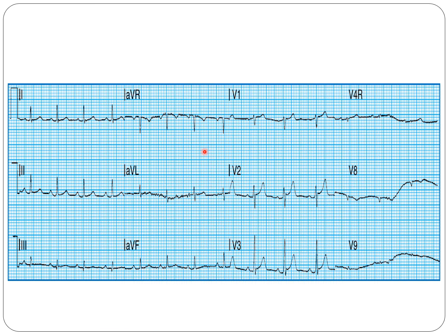All right, the pathological conditions that we can look at. There is nothing in the limb leads. I cannot see anything. In the chest leads, again, I see nothing. That can be completely normal. And there is no posterior involvement, only maybe a little bit taller T wave, but it's not as high as it should be in hyperkalemia. So that can be a normal sinus rhythm.